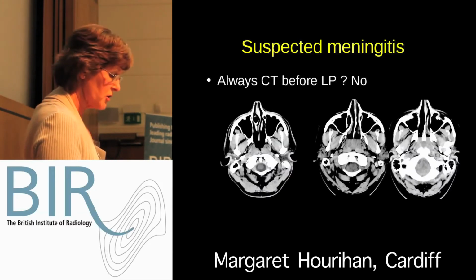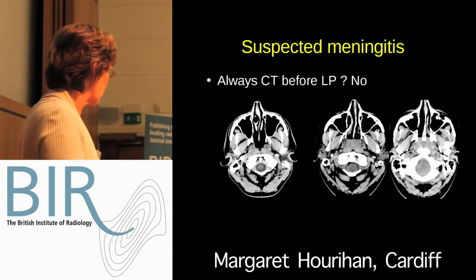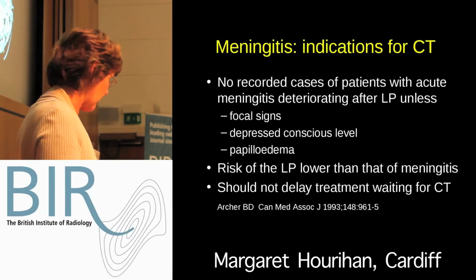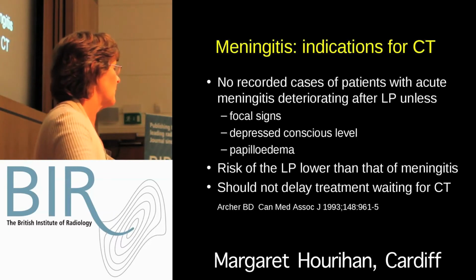I know our clinicians often ask us to do it, and they want to see the foramen magnum looking like this. But in fact, even if the foramen magnum looks like this with slightly low cerebellar tonsils, the patients don't encounter any harm from having an LP.